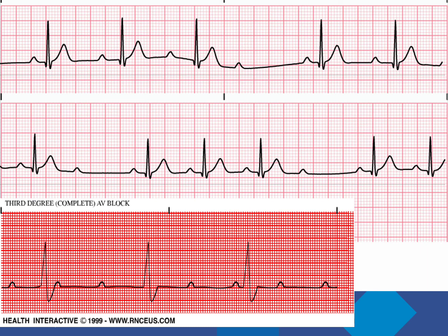In certain ischemic conditions, for instance after myocardial infarction, this could herald a complete heart block. Generally requires no immediate intervention, but we need to let cardiology know about it, especially if the patient is being admitted with an MI. Tracing 3 shows a complete heart block, and in a symptomatic patient we would require emergency transcutaneous or transvenous pacing.